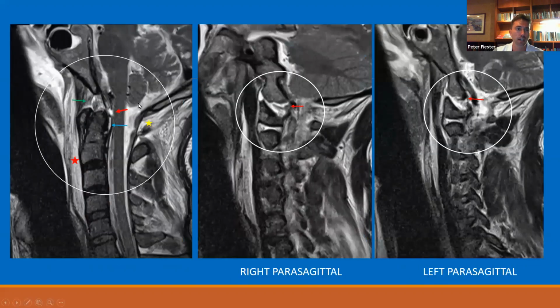And then this patient got an MRI, and this is the appearance of all these ligaments. So you just saw a normal picture. This is the abnormal appearance, where the tectorial membrane is ruptured right here along its subclival component. The transverse atlantal ligament is at least partially torn. The anterior complex is torn. There's edema in your posterior membrane complex.